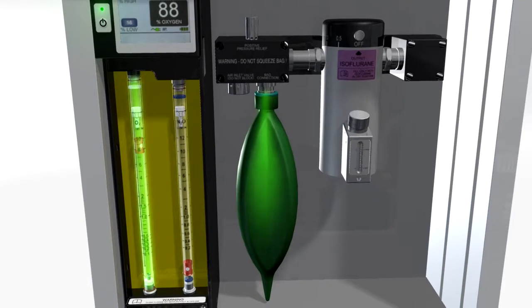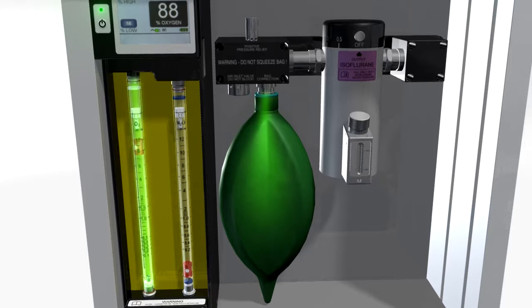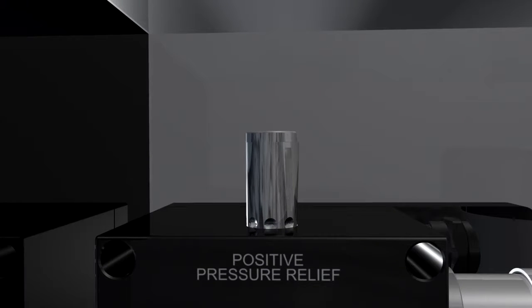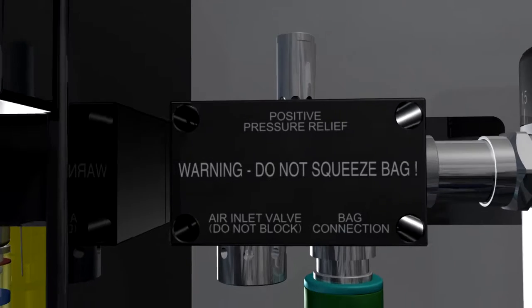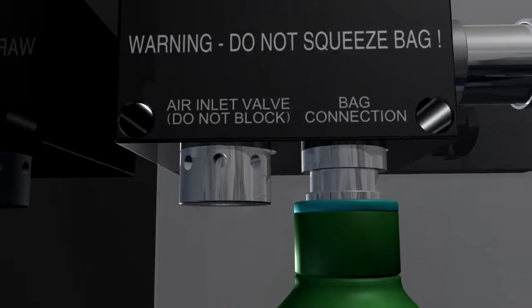The back bar serves three functions. First, the reservoir bag stores the oxygen. It can hold up to 2 liters. Second, the pressure relief valve limits pressure in the back bar to 5 centimeters of water, protecting the patient from harm. Third, the air inlet valve allows room air to be drawn in whenever the supply of oxygen is less than the demand, as expressed by the patient's minute volume. We'll come back to this shortly.